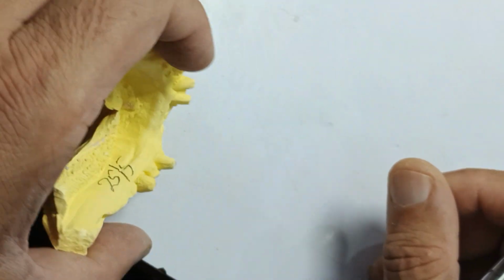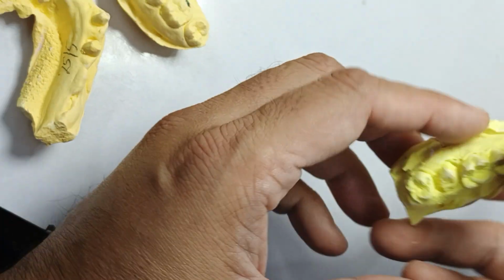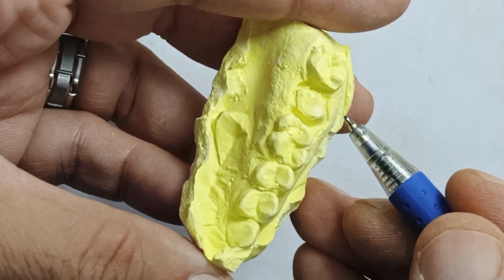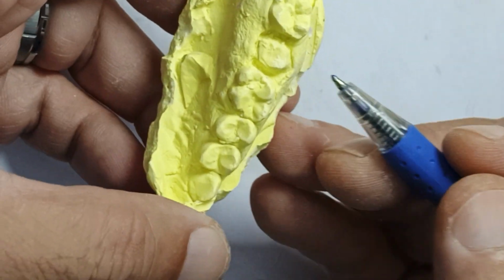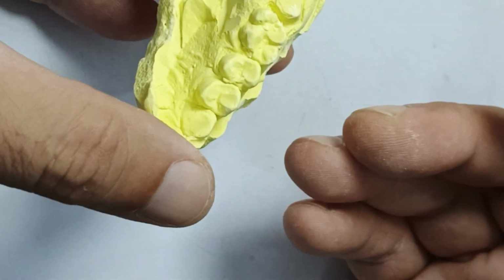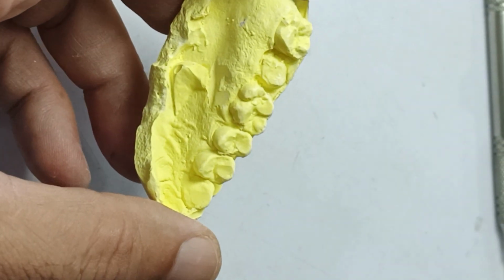No wonder everybody boasts that we do crown preps in 2 to 5 minutes each tooth. This is the preps they're doing. Where is the margin right there? This is soft tissue. In the improvisation group, everybody's talking about electrosurge. Everybody's talking about laser surgery, and we have this laser and that laser, and we can do the margin exposure with diamond and cut the soft tissue.